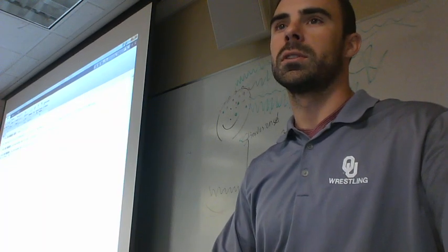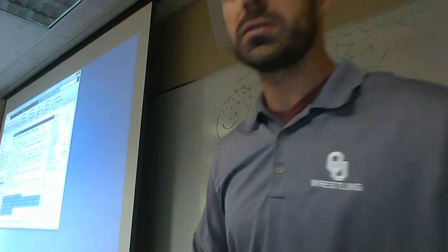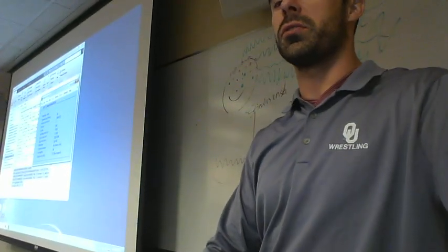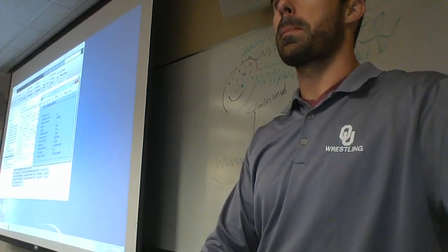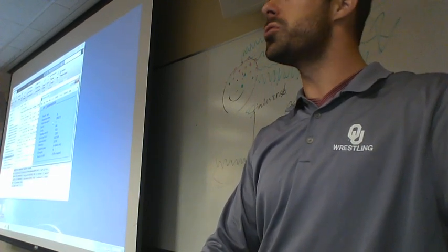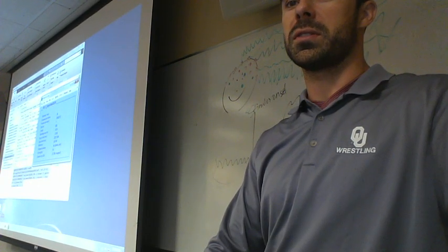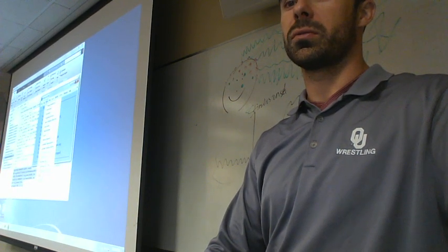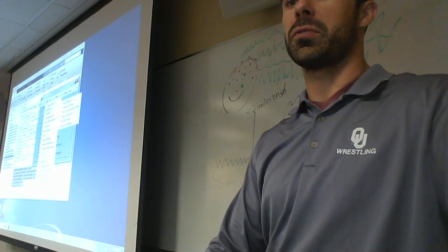All right, so let's do more stuff. Bring up the GUI. The first thing we want to do, now that we've imported it, is high-pass filter. What the heck does that mean? Well, let's do it and then we'll talk about it. We're going to go to, let's see here, edit? No. We are going to go to tools and filter the data.